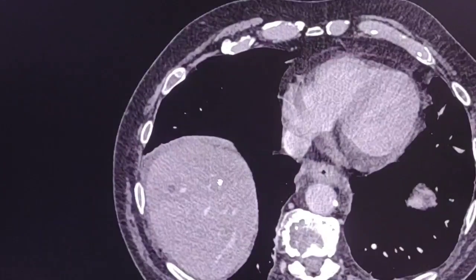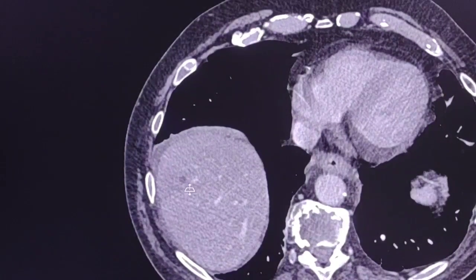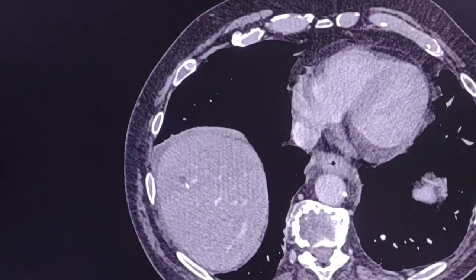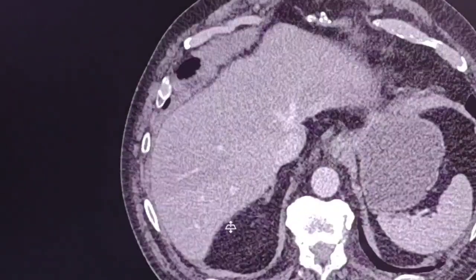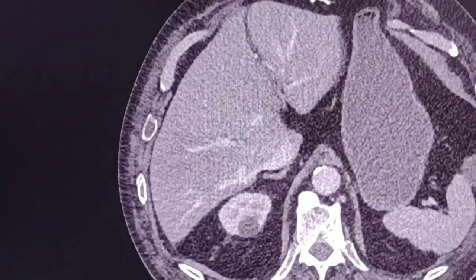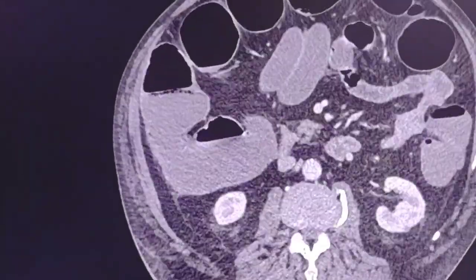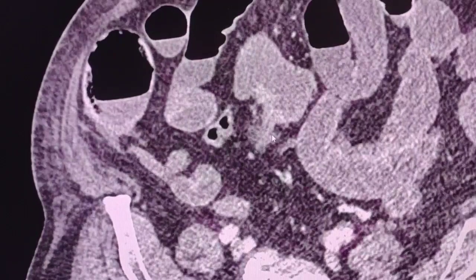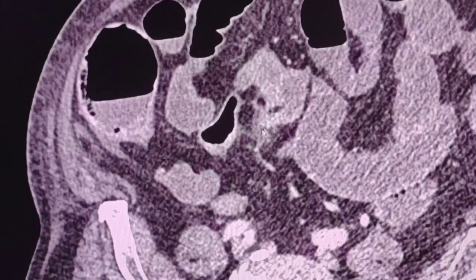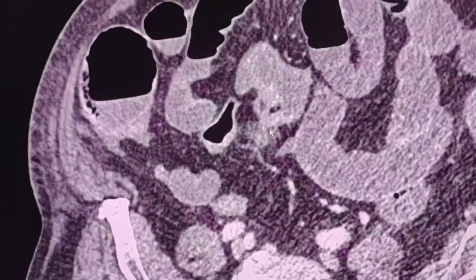It's very difficult to characterize, particularly given the small size of the lesion. Probably this is a cyst, but further evaluation is recommended with ultrasound to be confirmed. I will scroll up and down around the colonic malignancy to have a second look again.